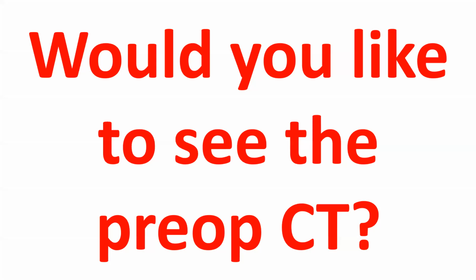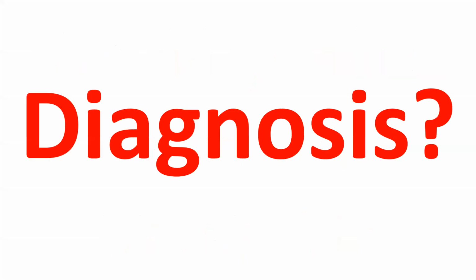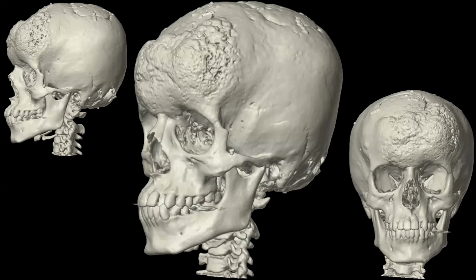Now, okay, let's run through it. Would you like to see the pre-op CT? Okay, I want a diagnosis. I've already given it to you. This is the pre-op. I could have shown you the pre-op. I chose to show you that you can get the same information on the post-op. It leads to the same conclusion. Why? Listen. Why is this not sarcoma? From the post-op, why is it not sarcoma?